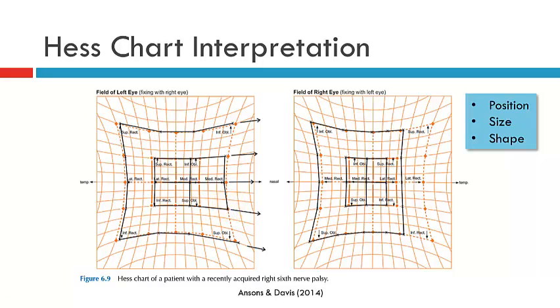This follows the muscle sequelae, where the left medial rectus is the contralateral synergist of the right lateral rectus. In relation to looking for the other components of the muscle sequelae, we can see there's really not much happening to the medial rectus of the right eye or the lateral rectus of the left eye. And so again, the fact that we're only seeing two elements of the muscle sequelae might be indicating that this is a recently acquired neurogenic palsy.